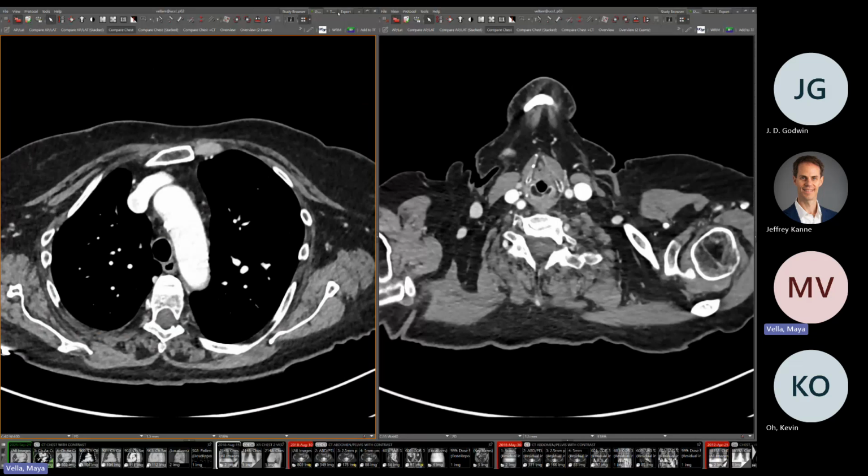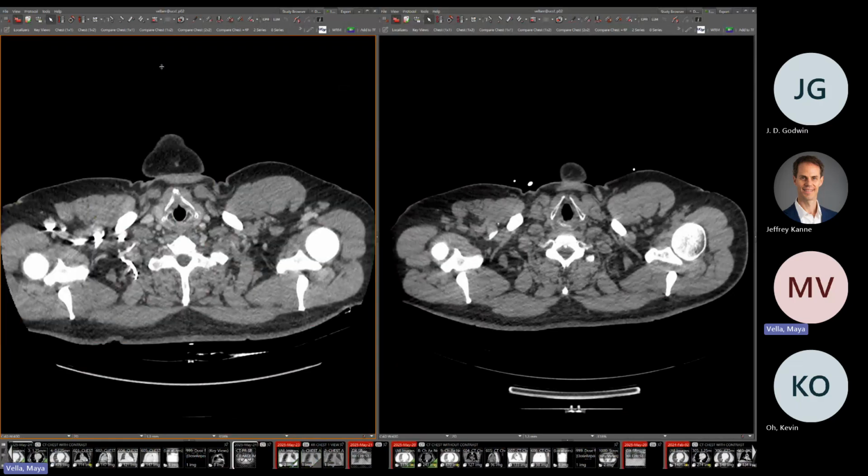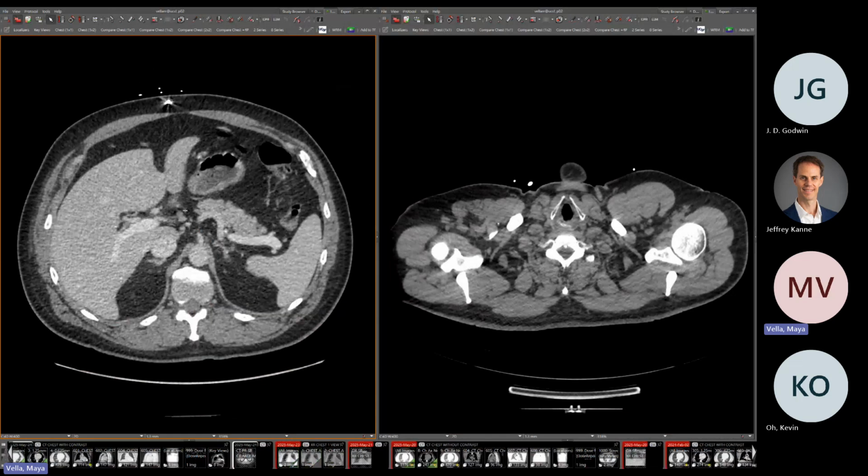All right, so that was that case. The device. So here's this patient's chest X-ray. Obviously, this person has a left ventricular assist device, and whenever we're worried about these, the thing that we're most worried about happening in patients with LVADs is driveline infections, because the driveline is the thing that goes outside of the body and connects this device to the external world. And so this patient was coming in with concern for driveline infection.